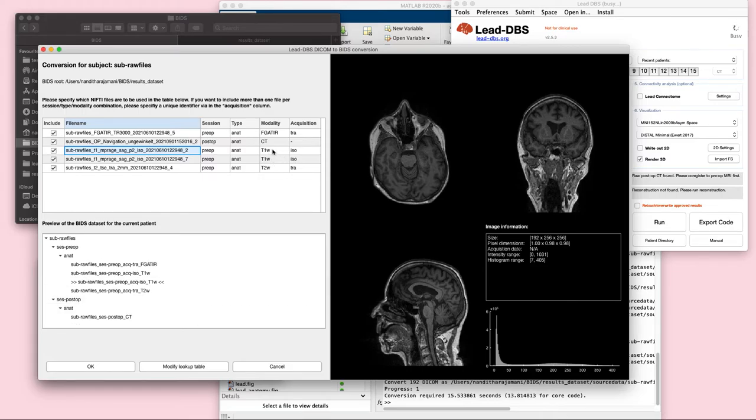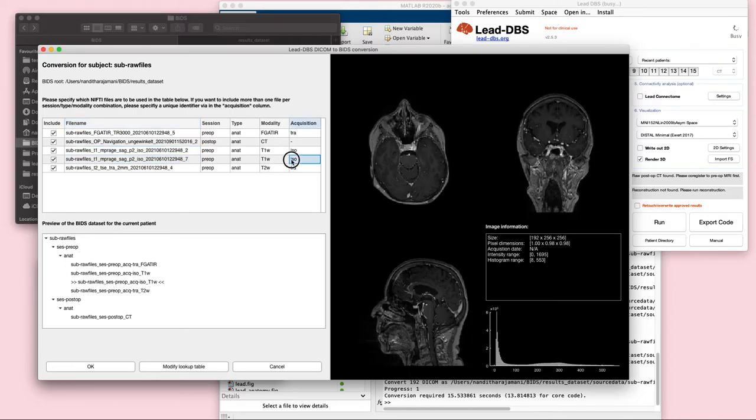You can include multiple T1 or multiple T2, multiple files of the same modality, by separating them using a unique acquisition key. So in this case, I'm going to say that the acquisition is a sagittal acquisition. I edit that by double clicking on this field and writing sag. And so now I'm able to import both of these T1 files. Otherwise, you will not be able to import two T1 files of the same acquisition type.